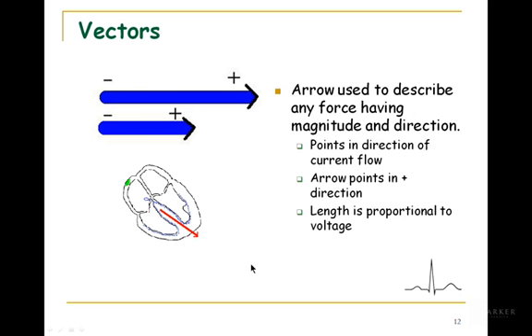Okay, so let's go over a couple of things and why they look the way they do. I'm going to be showing you pictures with red arrows in there, so I've got to describe to you what vectors are. You should already know what vectors are, because you should have learned it in one of your radiology courses. Vectors are often used in physics.